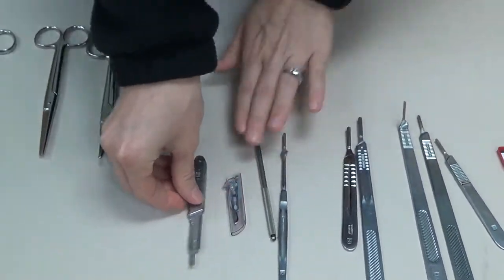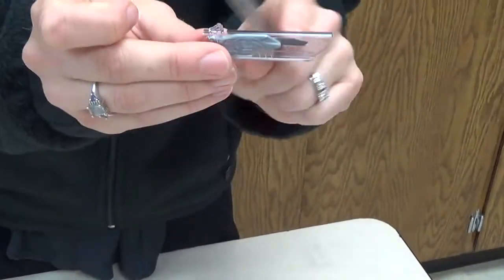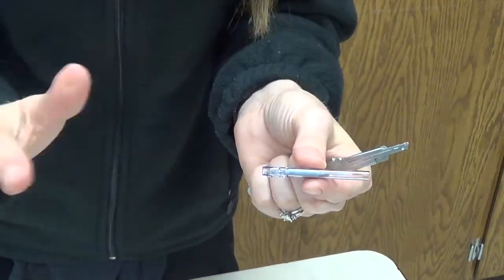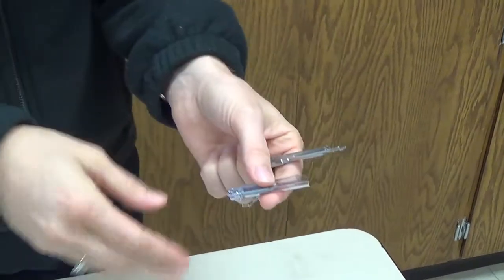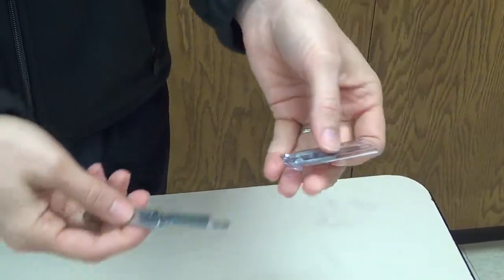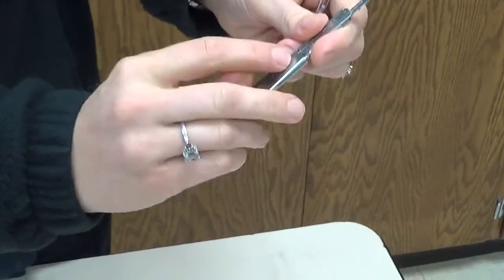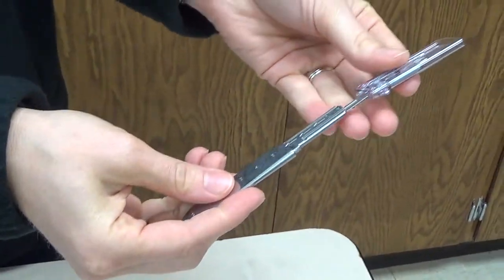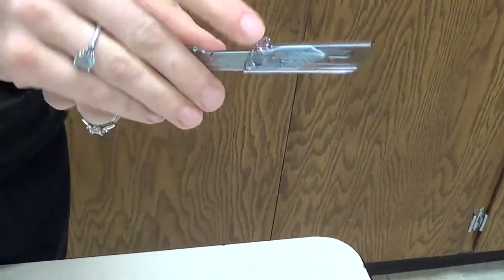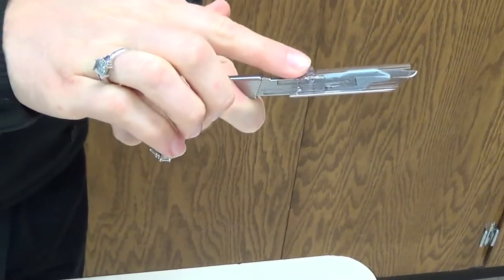Now, in some facilities, they will utilize safety handles and safety blades. So a blade that's a safety blade has some type of a protective mechanism over the top in order to help prevent sharps injuries occurring when we're transferring the blade. So there's all different types of these, but they're very similar in how they load. So when we talk about how we load a knife, remember we always line up the bottom angle on the bottom of the blade with the angle that's at the bottom of the handle here. So when we load those, you're gonna just fit them together. The way that this safety mechanism retracts is you just push down on this and then it pulls back. And then in order to push it back, you just push it back over the blade.